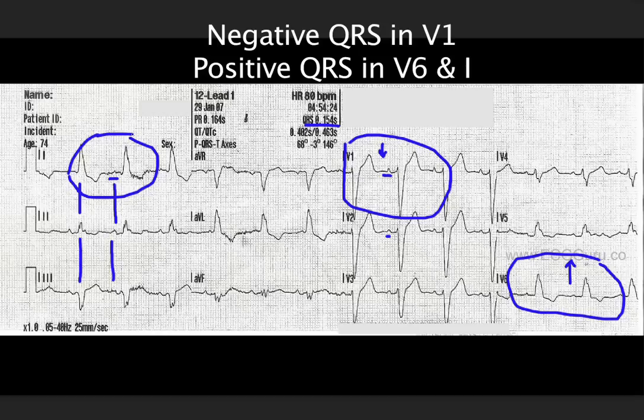So if I were doing a quick poor man's screening for left bundle branch block, I would do it this way. I would say the QRS is wide, I see P waves, not too well in V1 or lead 1, but I see it in lead 2. And lead 1 is upright, so I think this is left bundle branch block, and I would be right.